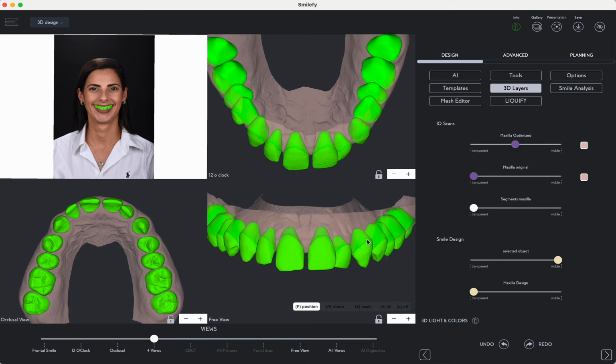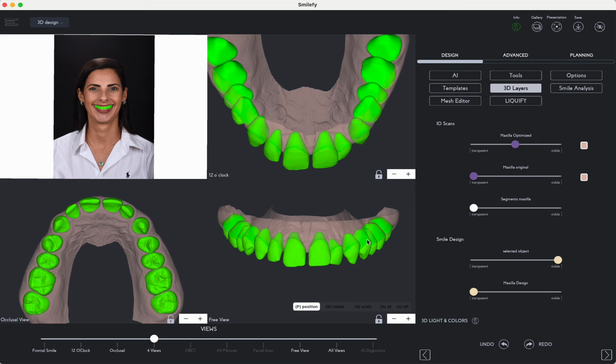and here we go. We do have the segmented teeth automatically done in the cloud. So now we have access to position rotation of every single tooth, and we can correct. I select rotation, and here we go.